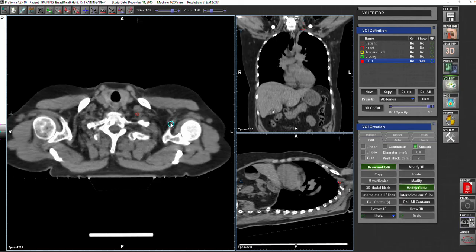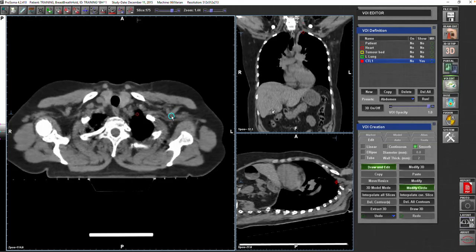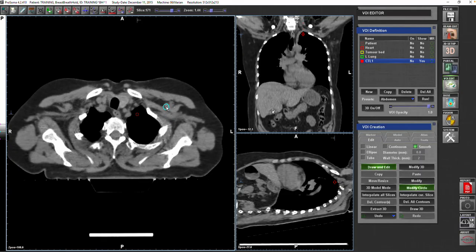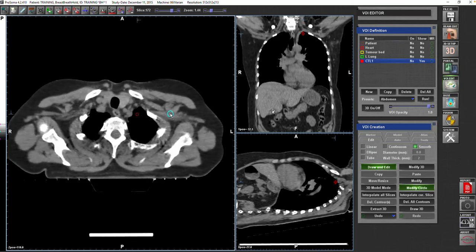When you go to the coracoid process, you will see that the V-shaped muscle starts to appear. This is the pectoralis minor muscle. If you go to the RTOG guidelines, they start level 2 and level 3 at the level of the pectoralis minor muscle. So this is a very important landmark for us if you are working with the RTOG guidelines. If you are using the ESTRO guidelines, you still want to know the pectoralis minor, because the lymph nodes in the interpectoral group will be between pectoralis major and pectoralis minor. This is number one.